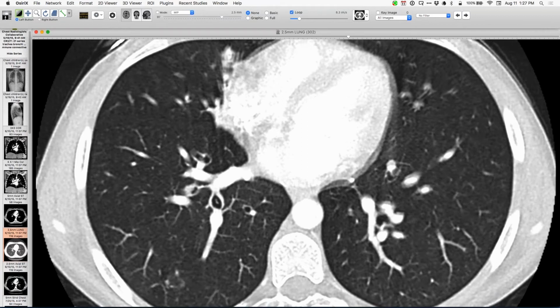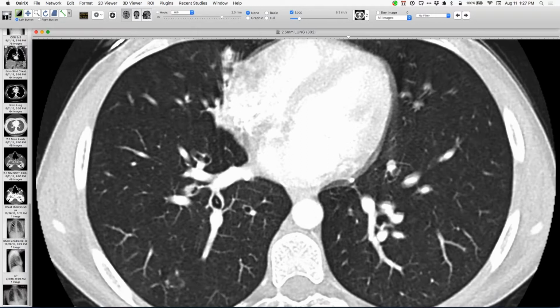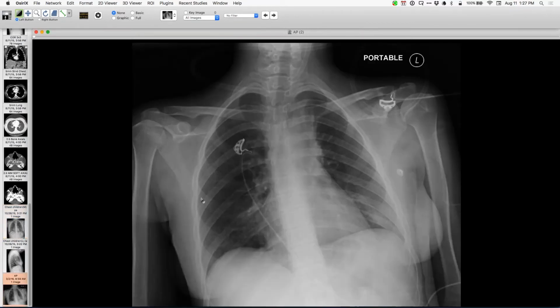Not surprisingly, over time, the reason I got to see this was that she has developed a stenosis of some airways. More recently, she's had findings consistent with that. And here you can see that her left upper lobe bronchus is stenosed. I don't have a CT to go along with this, with some volume loss, so severe airway involvement. And the sinuses just look terrible.